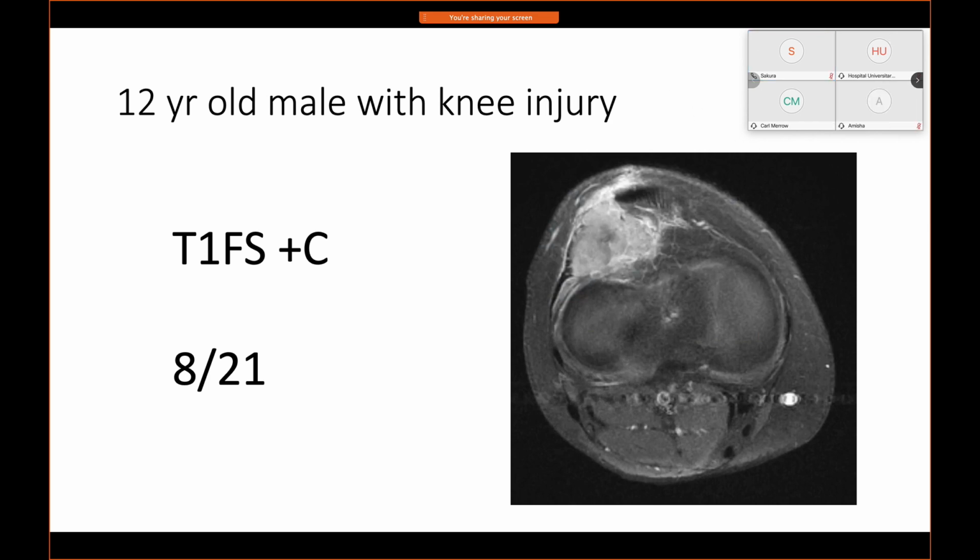Perfect. One thing we've had as a rapidly growing, solid, somewhat vascularized mass is nodular fasciitis. Certainly mimic a sarcoma in appearance, but I would certainly default to the first item that was given in the differential. Yeah, no, and Takira, that's great. And it seems like once a year something will come through our department that looks completely benign initially, and then it'll be a synovial cell sarcoma.